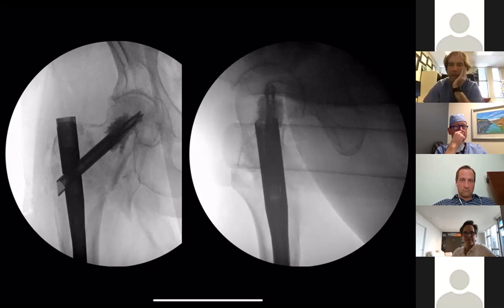Yeah, so is your expectation that this is going to shorten along the axis of the device such that we get some intrinsic stability? I hope. I think it is going to hit maybe up top first and then slide down on the shaft a little bit and then maybe go a little bit into varus, but maybe heal before it all can go bad.